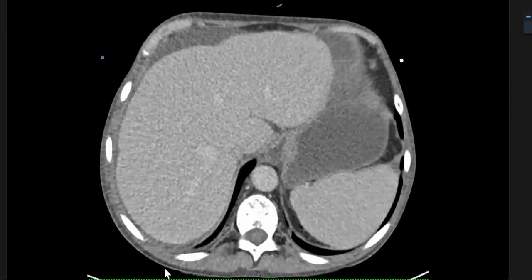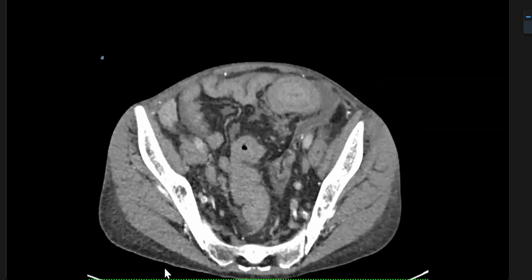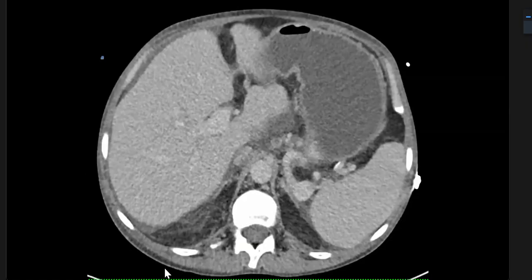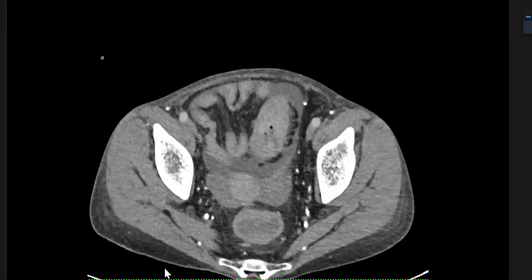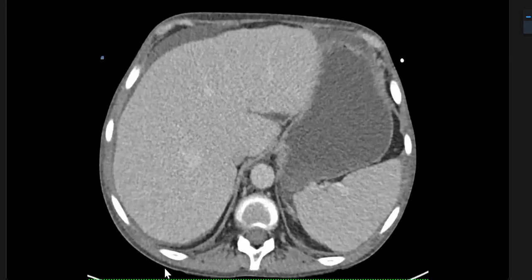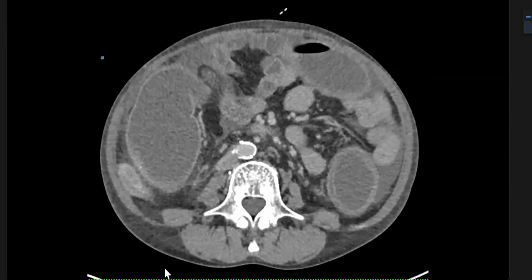Okay, so you've been given a patient with a history of abdominal pain. First things first, when you see a scan, you just scroll through it from top to bottom, first slice to the last slice, then gather and assimilate the information, and then speak your mind out.